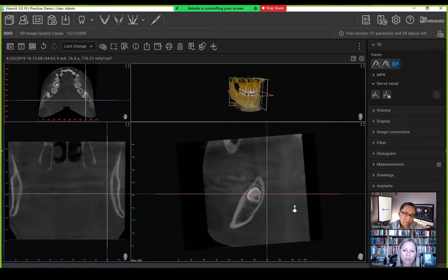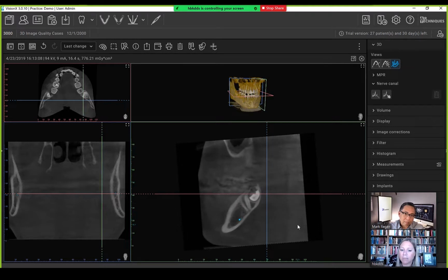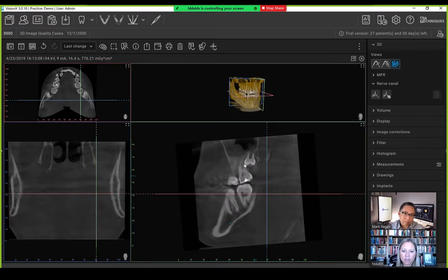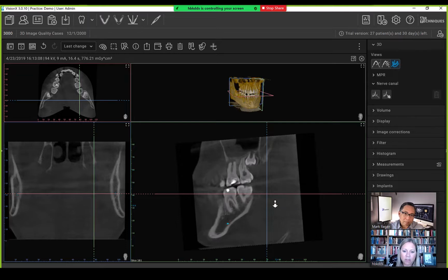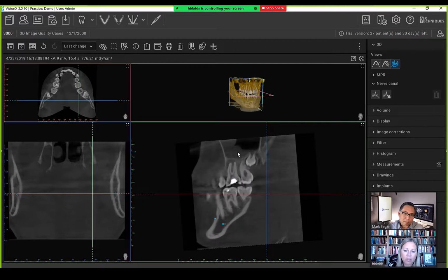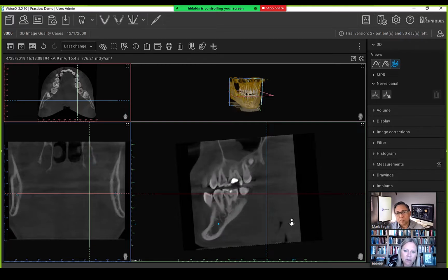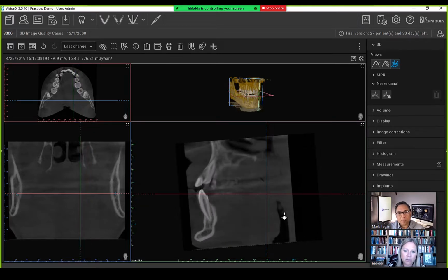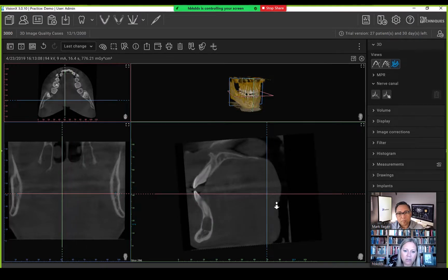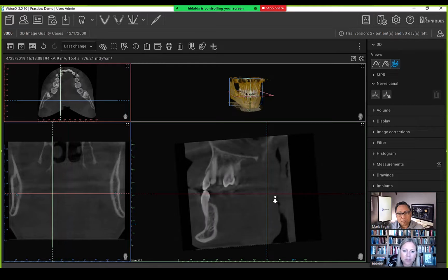And then I'm going to go from the left side to the right side, looking at the maxillary dentition. So, and the relationship of that third molar to the distal aspect of number 15. Want to make sure there's no root resorption. Obviously, we can see 14. We have a nice periapical lesion with most likely an associated mucositis. And see all the way around, but definitely making sure that everything looks good. I'll come back to that. Okay.